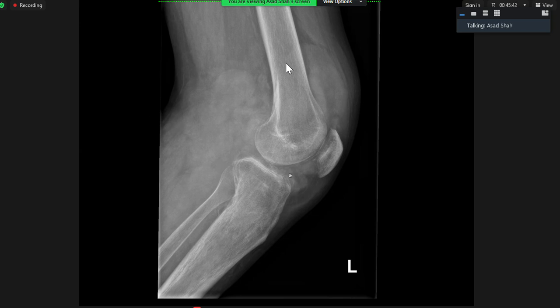You mean there, is it? Yeah, within the joint and also in the distal aspect of the femur posteriorly. Yeah. So this is all this abnormality there in the synovium. Yeah. It goes into Hoffa's fat. You said rightly, it goes back as well, right?